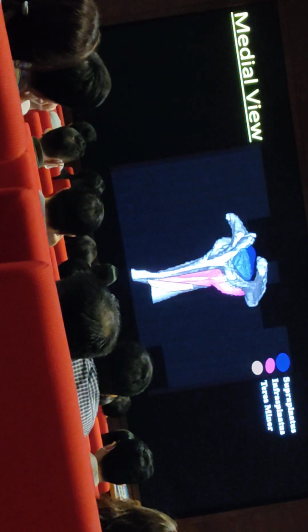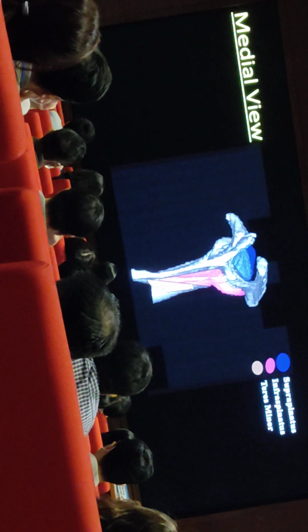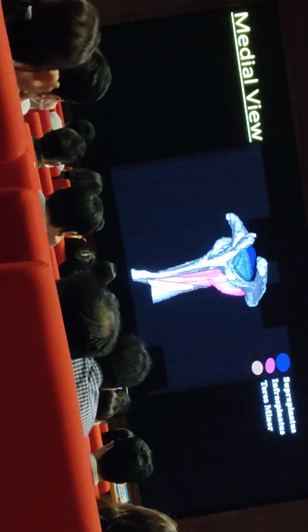And this is how the muscle looks in arrangement in the supraspinatus and infraspinatus fossa.